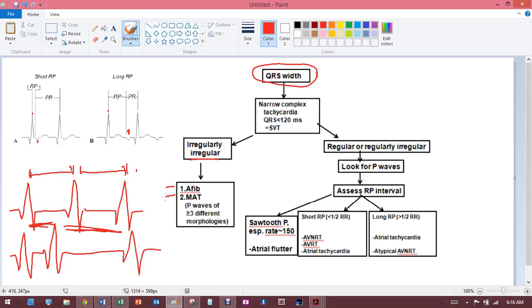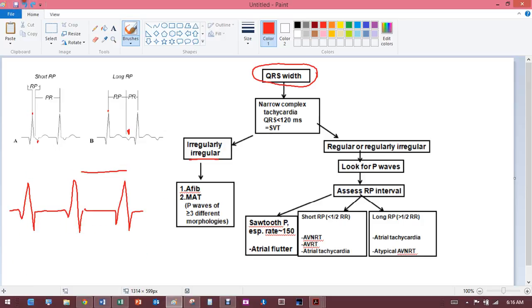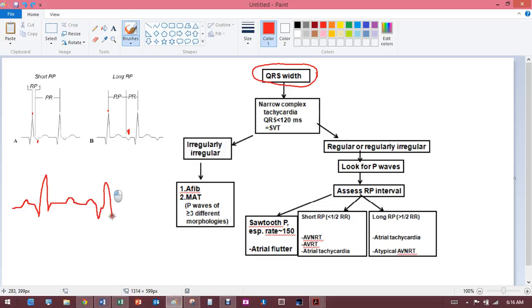Well, usually when you look at atrial fibrillation, see this little guy right here, the little A wave, excuse me, it's the P wave. So normally in a rhythm, you're going to see this little wave that's going to fire prior to each complex. So it's going to go like this: P wave, and then Q, R, S, and then you're going to get a T wave somewhere in there, and then you're going to get a P wave, and it's going to continue like that.